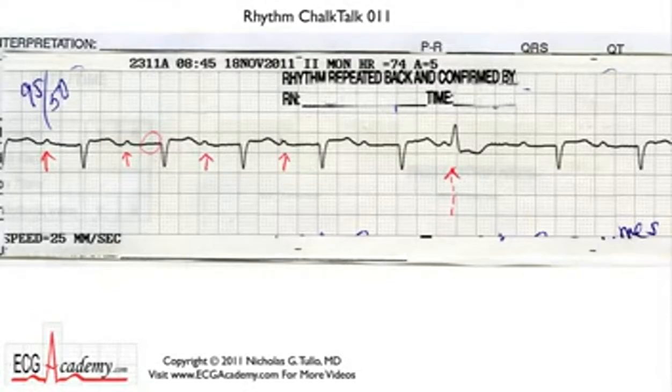So let's start to measure intervals. We take the beginning of the P wave on this heavy line, and you can see the PR interval is about 400 milliseconds. Pretty long, and since it's greater than 200, we'd call it a first-degree AV block, and it looks to be pretty constant. Let's bring out our calipers. You can put the calipers on the tip of the P wave or the beginning, depends on what you see best, but there definitely seems to be P waves mapping on through.